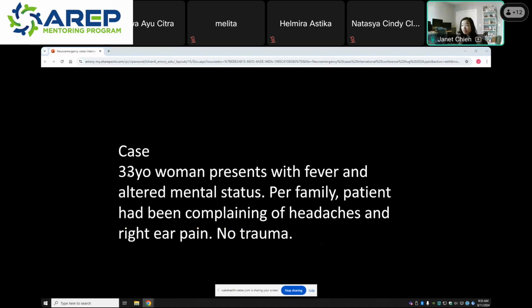So next is, oh, did I hear something? It seems like one of us got it right. Globe rupture with vitreous hemorrhage. Yeah, I just saw that. Great job. Okay, all right. Awesome. We can move to the next one.